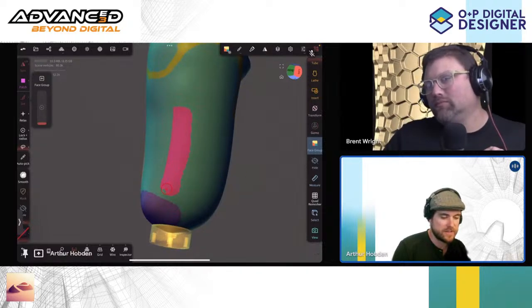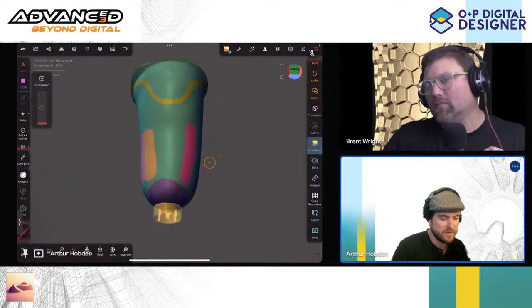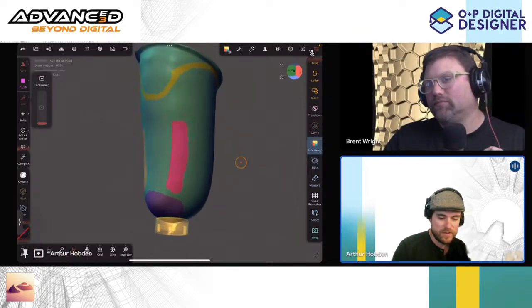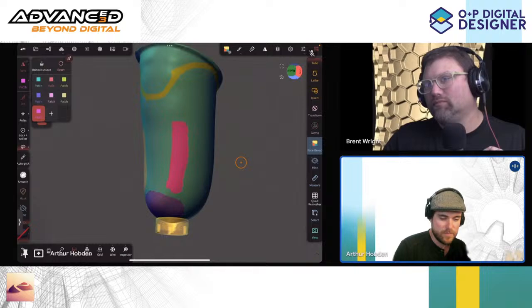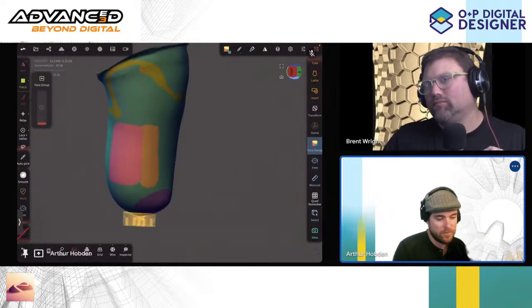Sweet. All right. Well, that's definitely enough zones to move forward. Is there any others that you wanted to include? That's it. Okay, cool. To do a flare for the wings, I might try and just make this group a little thicker so we can call upon it later. That might be the only thing I want to do.